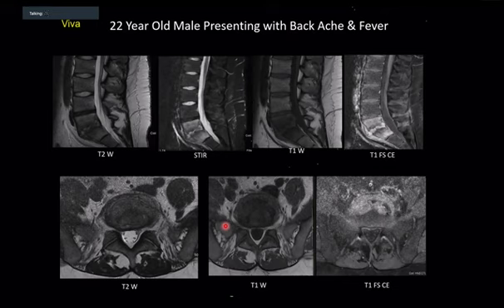On the axials, I cannot see anything in the paravertebral regions, looking at the muscles. So basically, I've got disruption of the intervertebral disc at L5-S1, loss of the end plates, and low T1, high T2, evidence of edema on STIR and post-contrast enhancement. These findings, given the history of fever as well, would be in keeping with osteomyelitis. Okay, fine. Thank you.